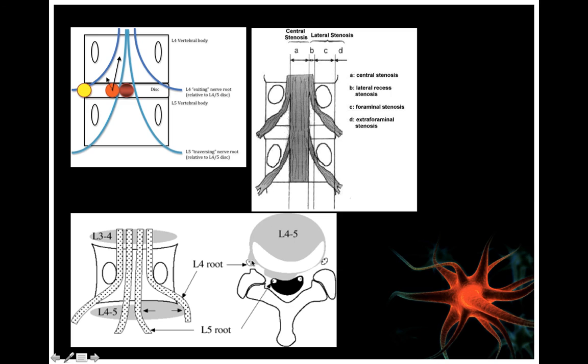So when we look at cross-section or the axial cut right through here, we're going to cut it right here and then look from the bottom up. Eyeballs are sitting down here and looking up into it, the axial cut, all right? What are we going to see? We're going to be looking at this disc from bottom up, right? We're looking at this foramen from the bottom up, so it's going to open up, and that's this section right here. And you have the spinal canal, okay? You have the facet joints on the side, spinous process sticking out.